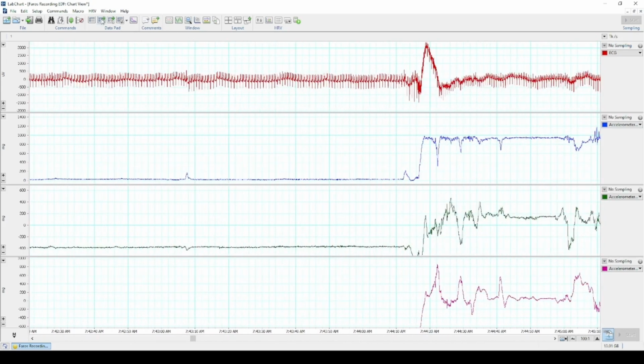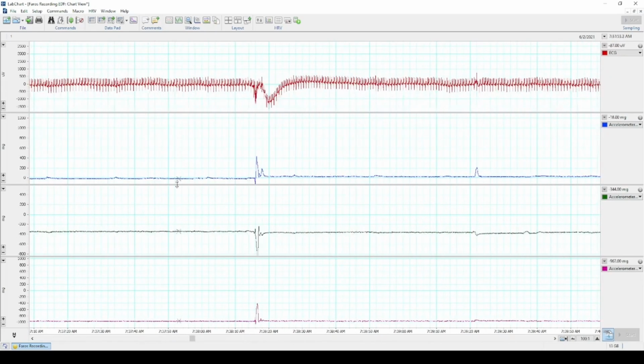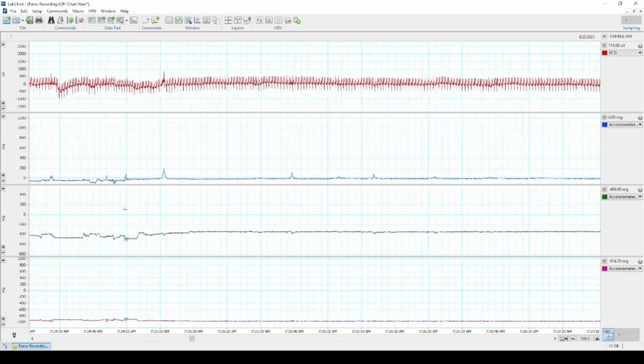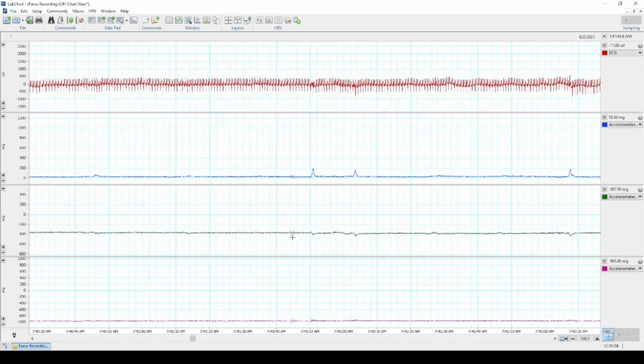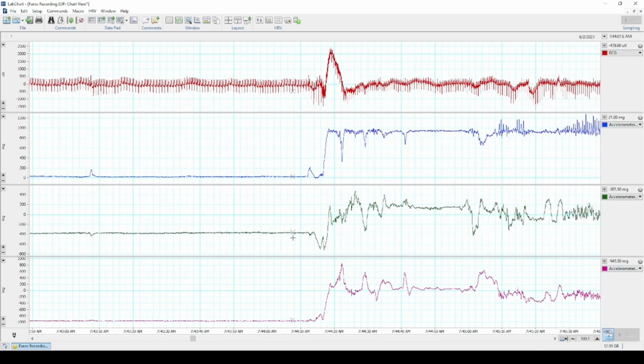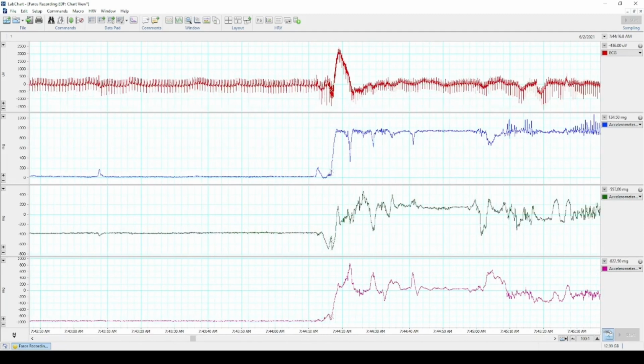And here we have it. This is the moment that this patient appeared to be sleeping all this time, maybe rolling around. Just a second right here. And this patient appeared to get up from bed at 7:45 a.m. right here.